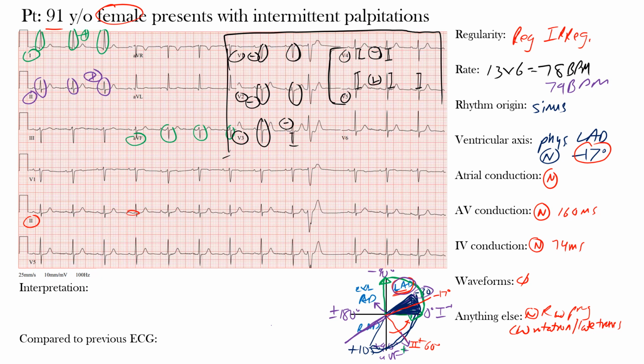Normally we would expect the QRS to maybe come here, but it's occurring there, okay? And this is that big T wave that you see there. So you have a QRS complex coming sooner than expected, no P wave seen there, okay? So no P wave, and again, then you have the beat that comes after, and again, this would be a compensatory pause because this would be two R to R intervals, okay?